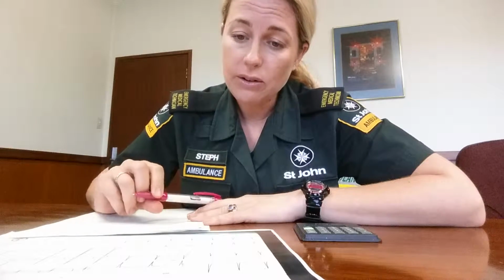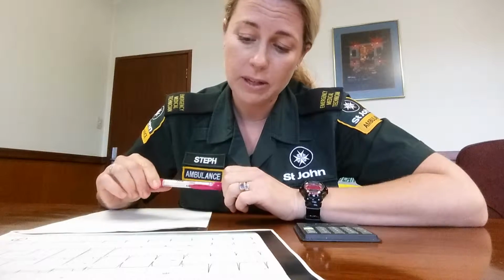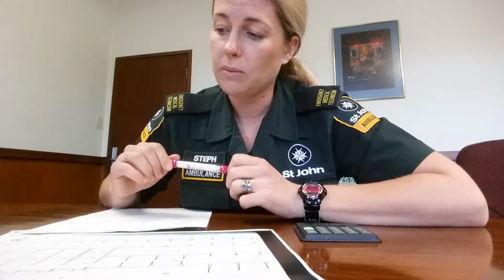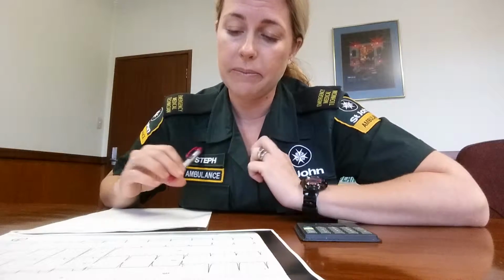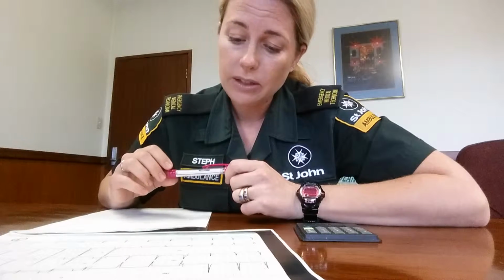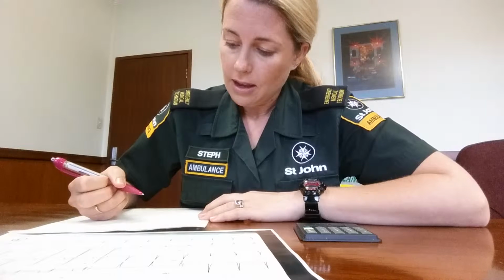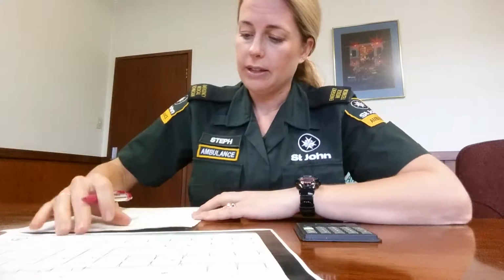I'll do a few tech errors. The paper speed should be 25 mm per second, which we don't have. We don't have a frequency response, which should be 0.05 to 150 hertz. I've got half a calibration spike, which should be 0.20 seconds wide and 10 mm high. AVR is negative, so it tells me that the limb leads should be in the correct position. There's not much artifact. There is a QRS in every lead, and I have no date, no name, no how the patient was feeling or interventions. And my R wave progression is early in V1.